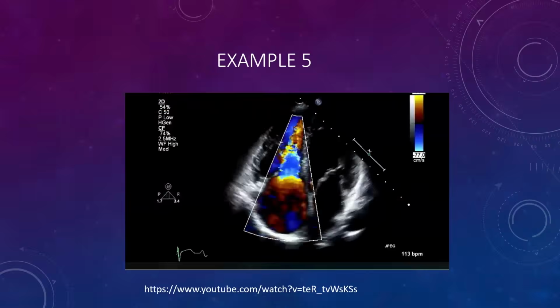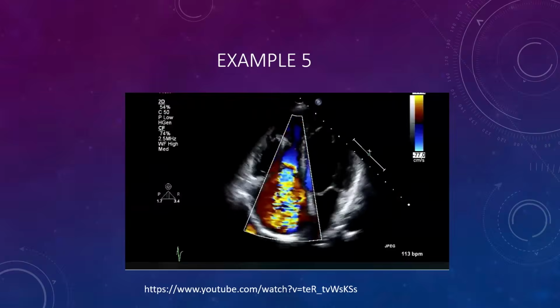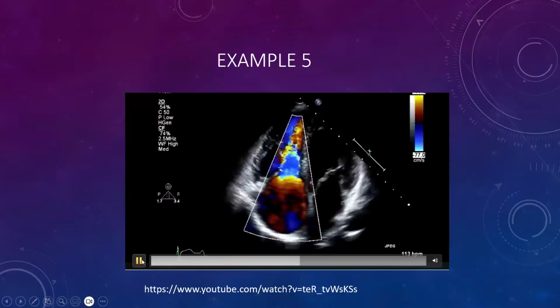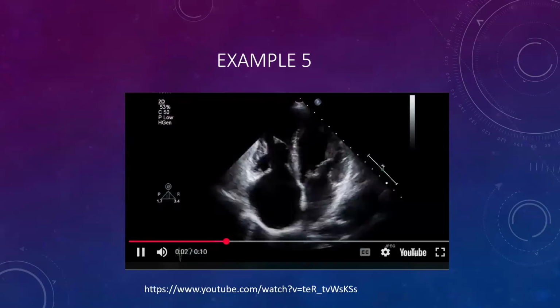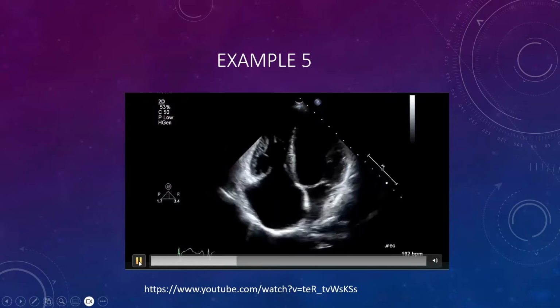Okay, and then this one, I was trying to find an example from one of my cases for this, and I had to use a YouTube one, but it looks the same whether I'm playing it or not in terms of the leaflet motion. Thoughts? The diagnosis that's screaming out at you here. Yes, exactly. Typically you have fixed leaflets, and as Dr. Leoncoy says, you don't even need the color to know that it's wide open here. I'll just play it again so that we can see it one time.